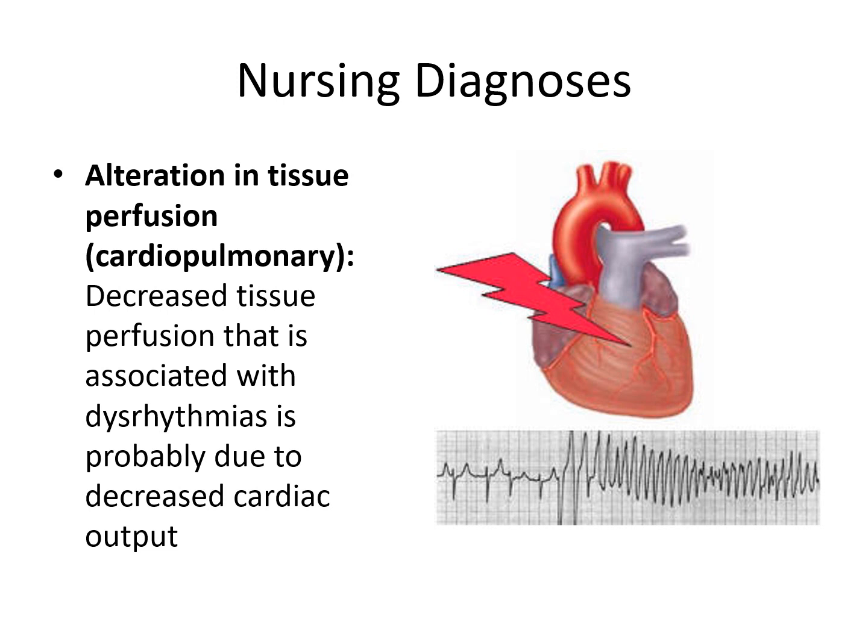There's decreased tissue perfusion that is associated with dysrhythmias, and it's likely due to the decreased cardiac output. I think we've talked about that quite enough, and you probably understand that by now. So we have in this picture, for example, it's very easy for us to recognize. Okay, we don't have to identify any waveforms. This is very characteristic of torsades de pointes. Okay, here's the isoelectric line running right through the middle, and we have both upward and downward deflections here. So that's just an example of an arrhythmia. And when the patient has this type of ventricular tachycardia, there is a real problem in the heart being able to perfuse itself. Okay, it's both cardio and pulmonary, so these two systems are intertwined.